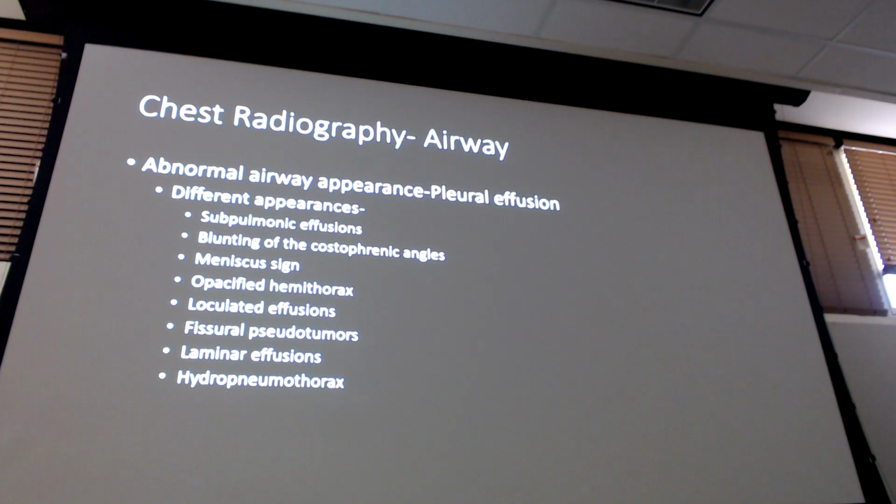Look at all the different things. Okay, so we're going to start to go over all of these little effusions, giving you more tools to notice a pleural effusion when you see it. Trying to arm you with many different ways to pull this out. Okay?